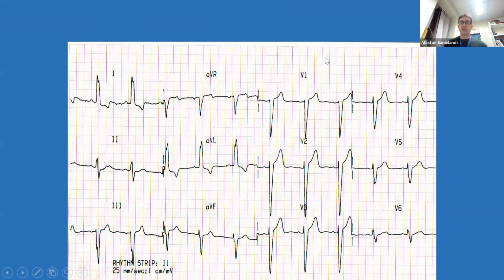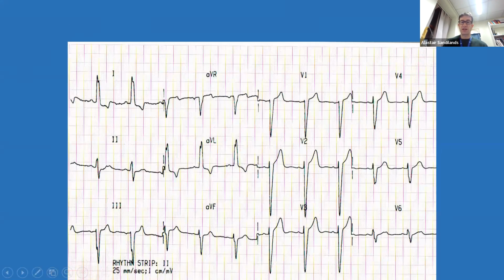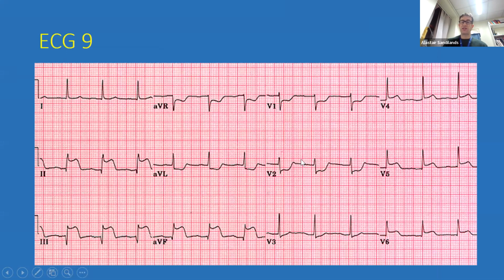Okay, so if this patient had chest pain that sounded cardiac, then this could be the ECG. Okay, there wouldn't be the marked ST elevation that you see here more than you do on the next ECG. So you can see here, even despite the QRS being broad, there is much more ST elevation, which you don't normally see, compared to this ECG, where there is some ST elevation, but not as marked. Can everyone see that difference that I'm trying to point to? So if we look at V2, yes, the QRS is broad, but this could be someone without chest pain. In this patient, there is much more ST elevation that you don't normally see to signify this is definitely ST elevation compared to this ECG.